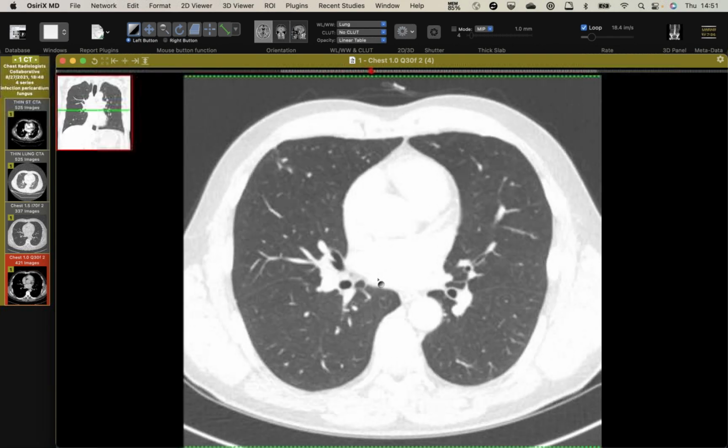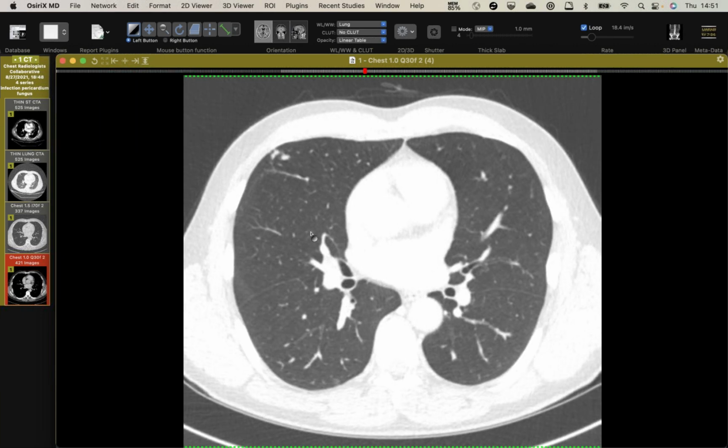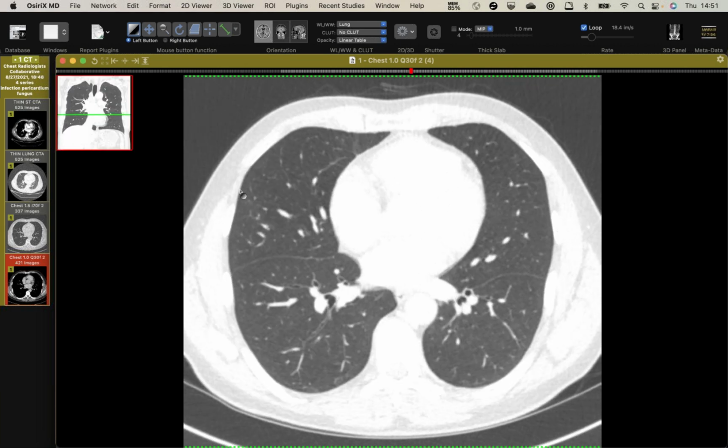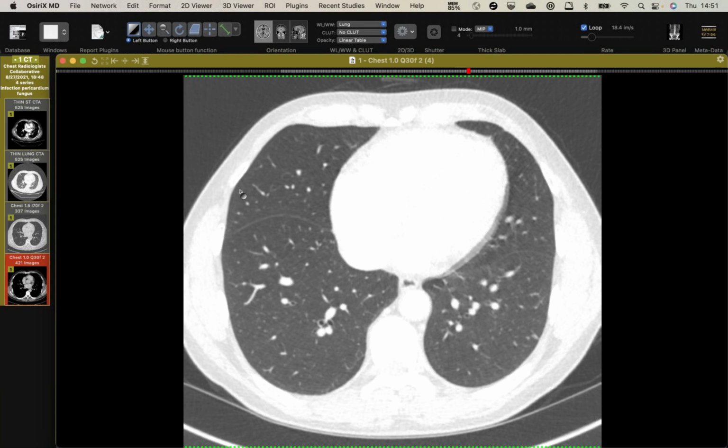And then there are those nice nodules there. So you get the dominant nodule and the little clustered nodules around it, and you can see some thickening along that vein, or the same thing here. Pretty classic for histo. So you get pericardial effusions with histo frequently? No, not at all. It's a known complication. It's just not one I've ever seen.